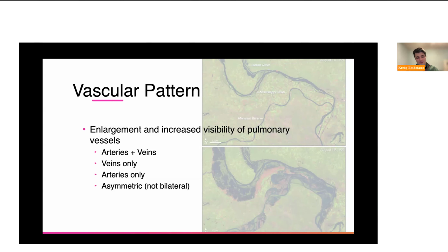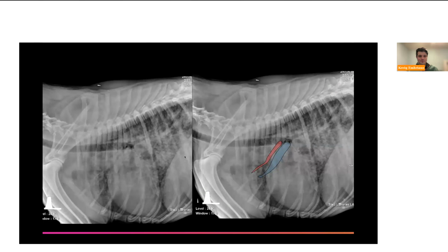Asymmetric you can get with shunting of the blood. If, say, the lungs on one side are completely collapsed, well, the blood's going to be shunted to the remaining lung lobes, and it's the same volume being pumped by the heart, and so the lungs have to adapt to that. Or if there's an infarct in a major lung lobe, and again, that blood has to be shunted to the other vessels, and then you get into weird zebras like arteriovenous malformations, which we're not going to get into.